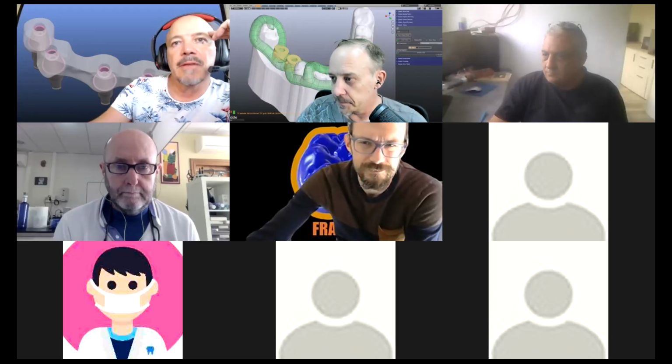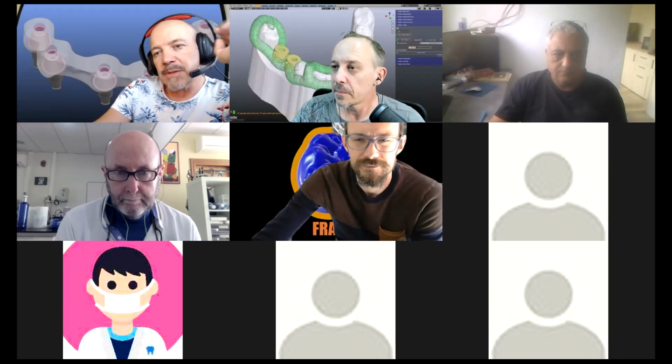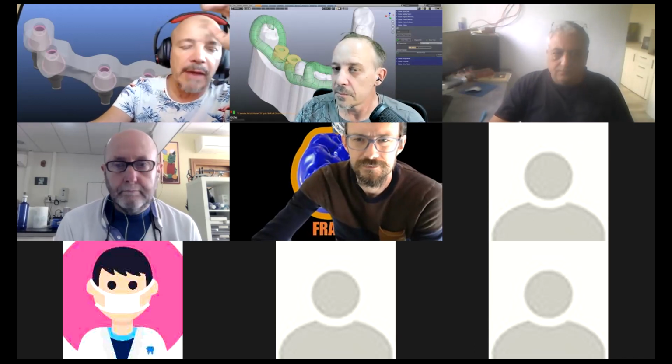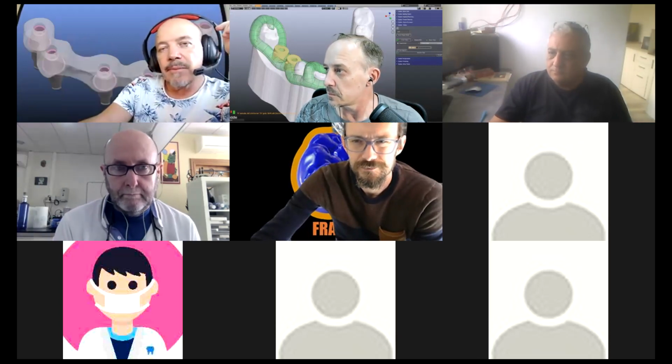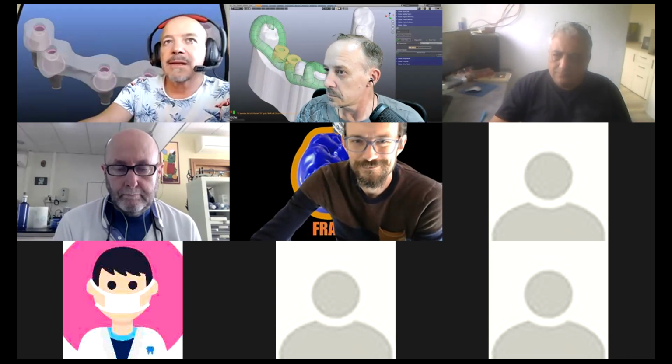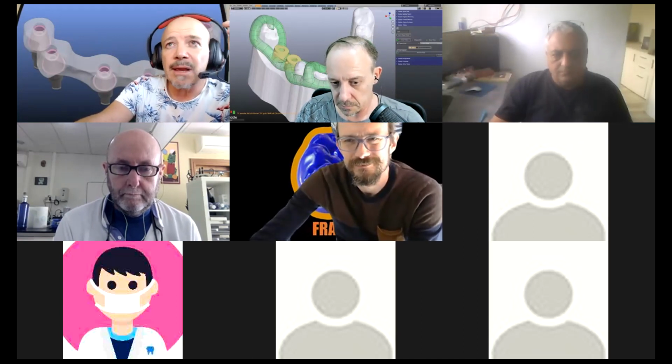Now, as Wolfgang said, this was given to us yesterday, and I'm still in the process of writing the scripts for this module. It's very, very complicated. So if something goes wrong or crashes or whatever, I half expect it and I half don't expect it. But I'd like to have your feedback if you've done custom abutments and you think something is good or something we should change.